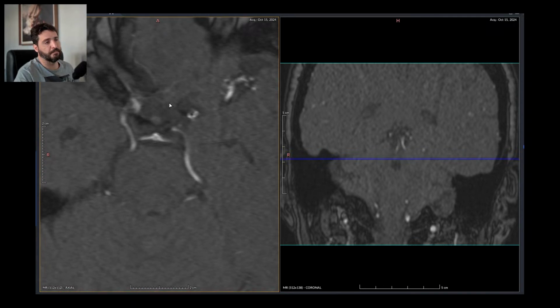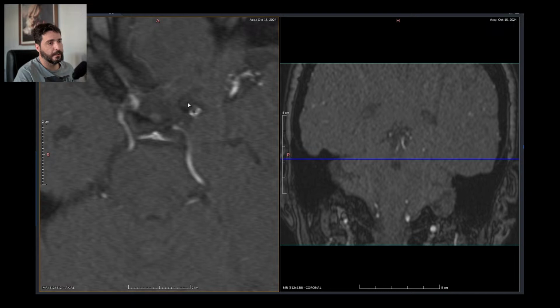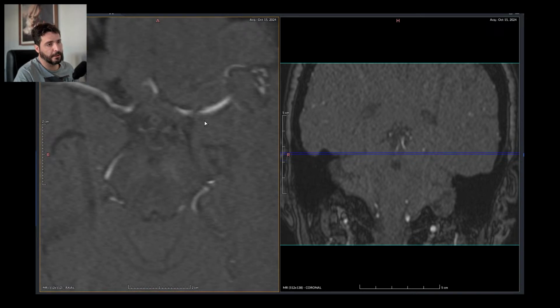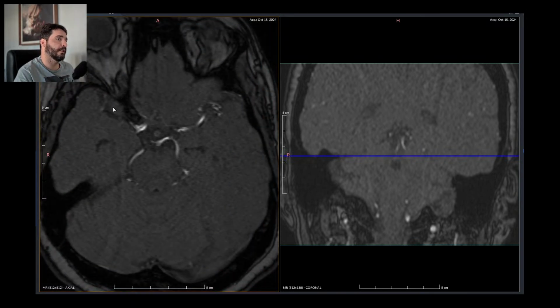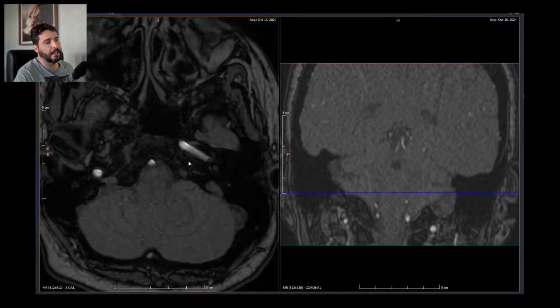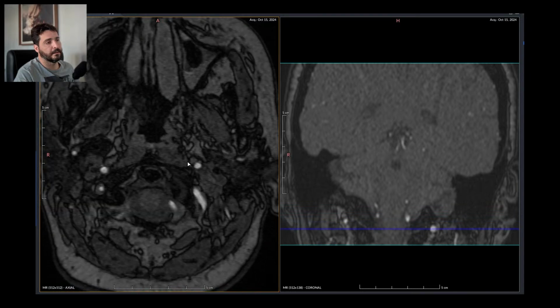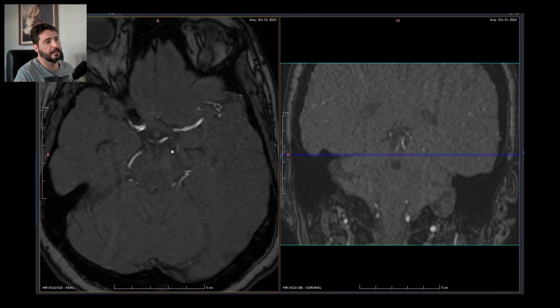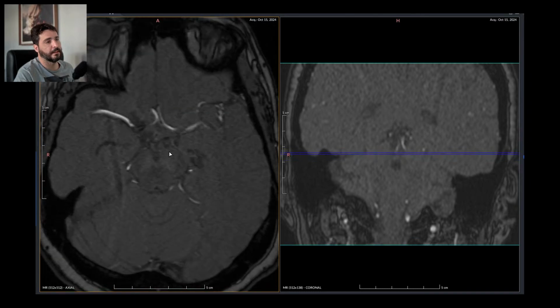See how the bifurcation, which is a very common site of aneurysms, is all screwed up. It's impossible to analyze because of motion artifacts and acquisition artifacts. So this is a very poorly calibrated scanner trying to scan a highly difficult, very complex scan, which is a time of flight sequence.